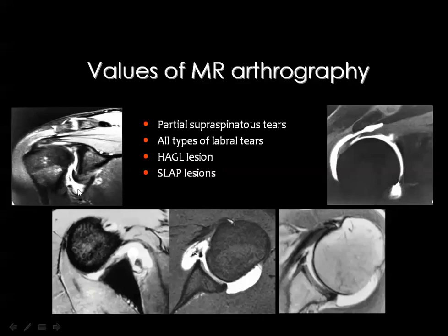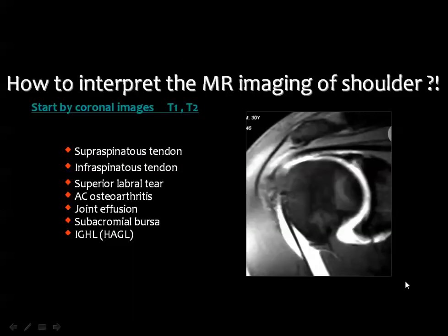You want to distend the axillary pouch to see this ligament and whether it is disrupted from the humeral attachment or the glenoid attachment. It is also very helpful in evaluation of injuries of the superior labrum, particularly when these lesions extend into the tendon of the long head of the biceps.